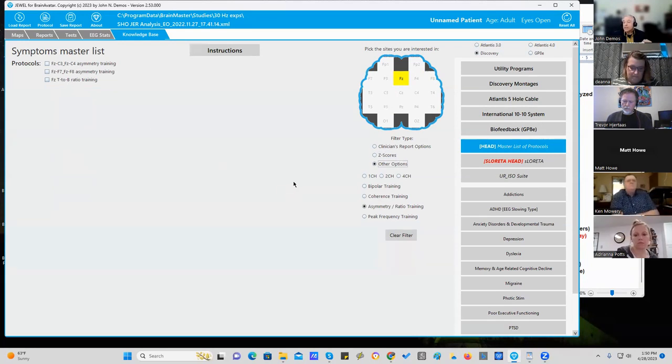Now, this is advanced usage. These protocols are all made for you. Or you have a client that has a low or a high peak frequency. You can decrease or increase the peak frequency right there. It's all set up, ready to go. If you're looking at 1-channel training, if you just want to train at FZ.